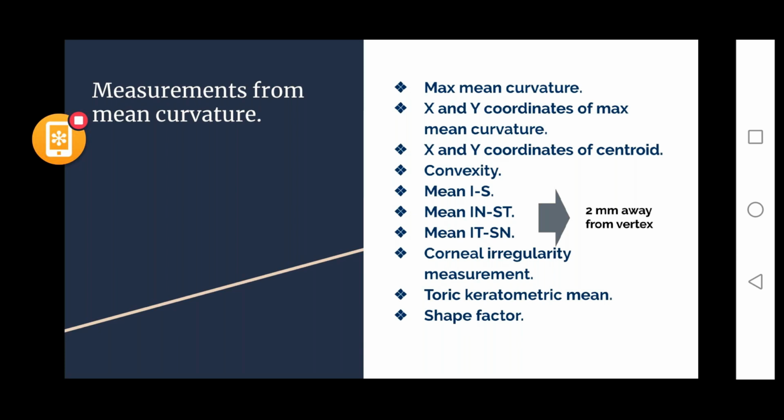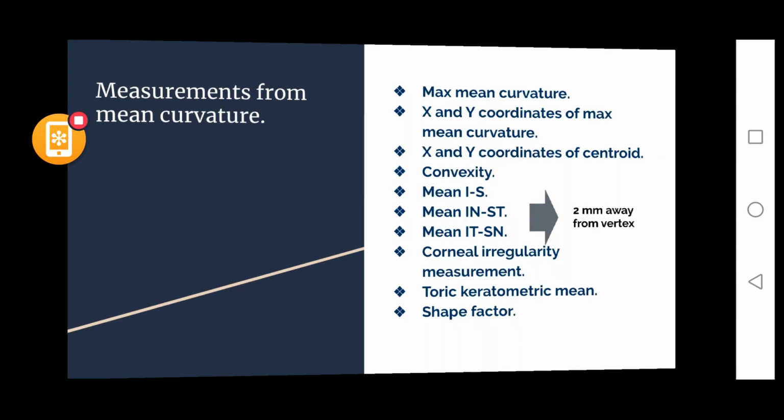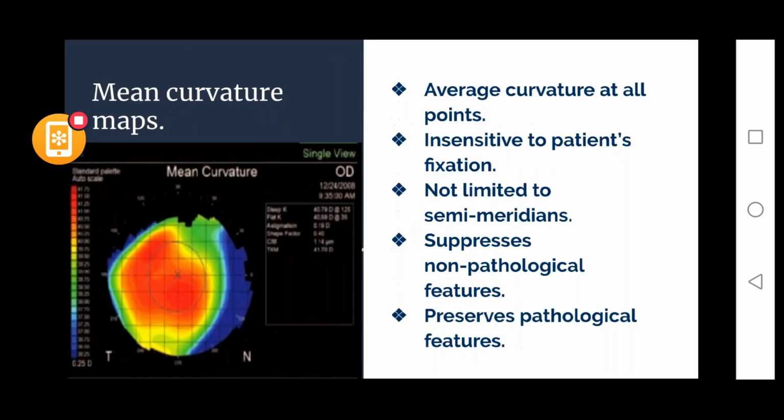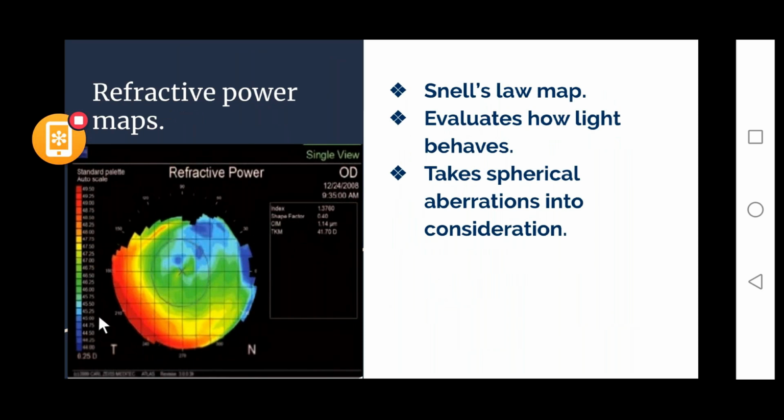So there is one question from Ajay Kumar, I guess. In the refractive power map, what does hotter and cooler color mean, sir? Let me just go back to the map. Just one moment. Yes, tell me. In the refractive error map, the color map, you mean? Refractive, yes. What do the colors mean, hotter or cooler, in the refractive power map, sir?